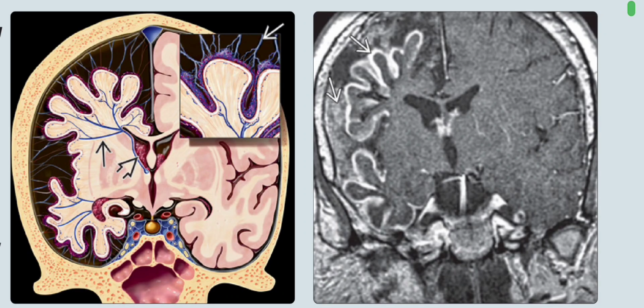So coming towards Sturge-Weber syndrome, left is the coronal graphic and it shows the extensive angiomatosis surrounding the affected gyri, prominent deep medullary collaterals shunt venous blood to the deep system, enlarged ipsilateral choroid plexus, and atrophy of the right cerebral hemisphere. The coronal T1 contrast-enhanced MRI on the right side image shows extensive serpentine enhancement of the thickened pia, which is also called pial angiomatosis, and enlarged subarachnoid space over the right cerebral hemisphere. Severe right-sided hemiatrophy is evident.